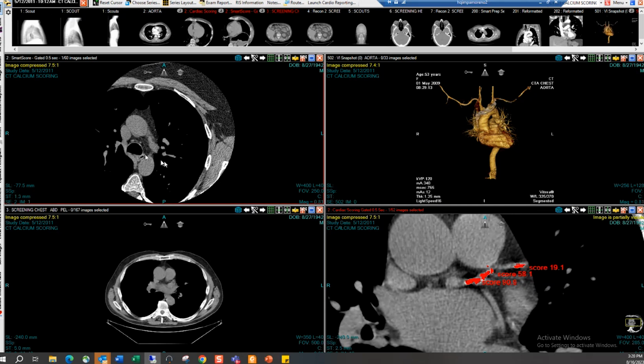These are the studies that we identified that I wanted to show you how we viewed them in NovaRad. And of course, this is just part of what we're talking about today. Dr. Scott, is there anything on these studies you wanted me to go over before I handed this to you? I think there's a couple things to talk about in sort of big picture things.